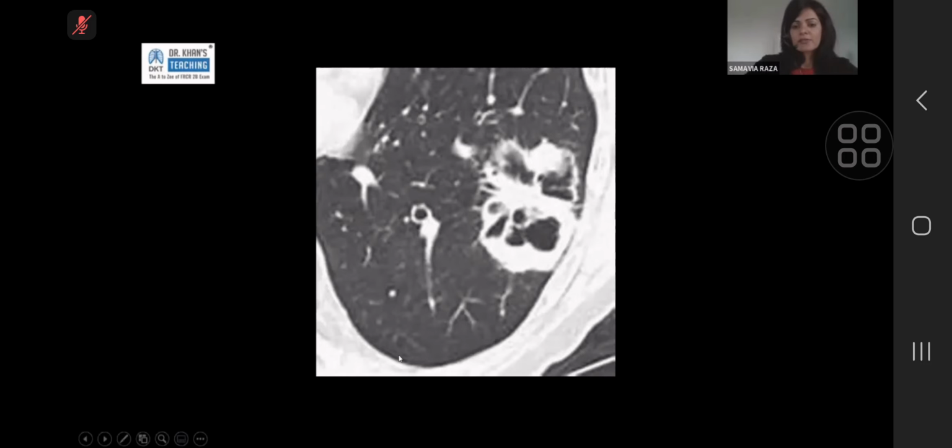So in this case, because the soft tissue component is so bulky, it is irregular. If the patient was asymptomatic, has no history of vasculitis, no history of previous infarction, because a small incidental PE wouldn't give you an infarct like that. You see some tethering of the surrounding lung, some architectural distortion.